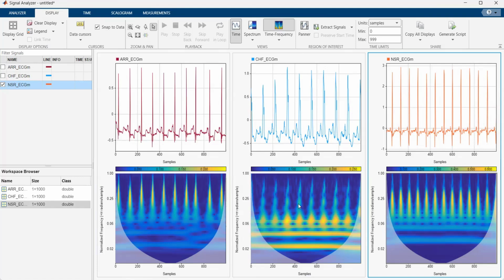Most of the time you'll find that when we have to use a CNN to classify signals, and if signals are very complex, the best way is to represent them in time frequency. Here we are not losing any information. We are just converting a 1D signal into a 2D signal. Here you see you have two colors. If you look at this burst over here, this one particular region represents one ECG cycle.